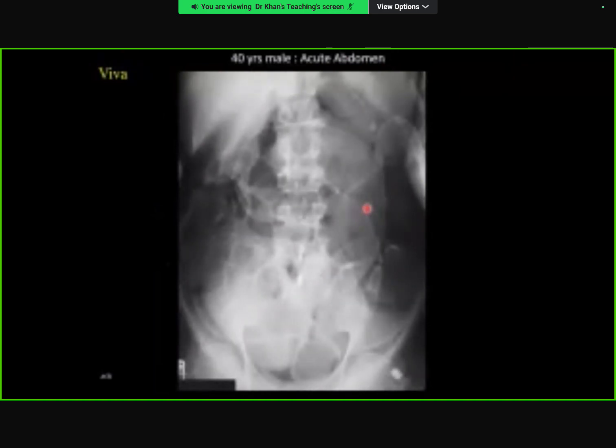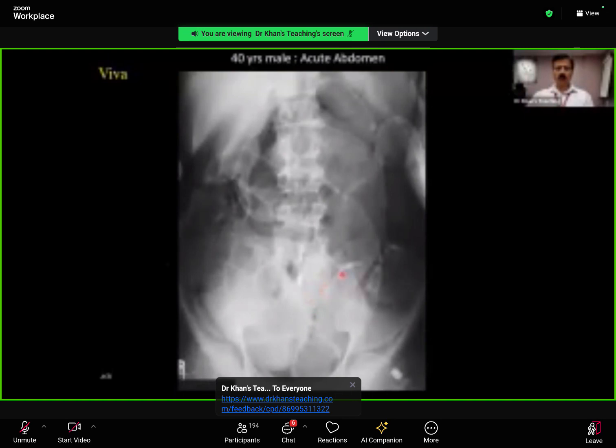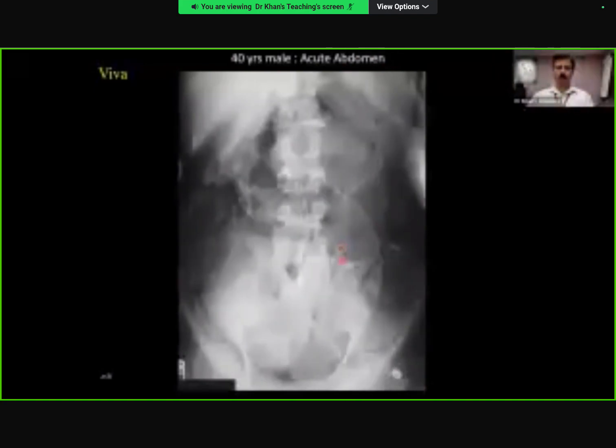Now, in your exam, pneumoperitoneum will always be shown on a supine abdominal film. In an FRCR level, nobody is going to show you a chest X-ray for that. So Rigler sign is one of them, where you see outer as well as inner surface of the small bowel. I warn you, when small bowel loops are dilated and distended, and they are projected over top of each other, at times we get what we call a pseudo-Rigler sign. So you might confuse it. Now, so this is Rigler sign.